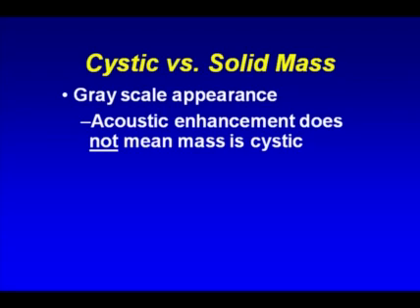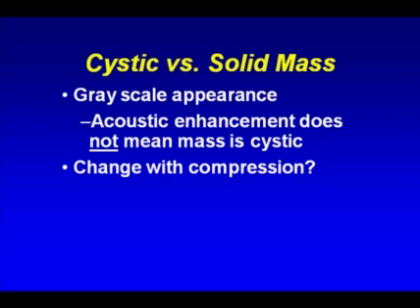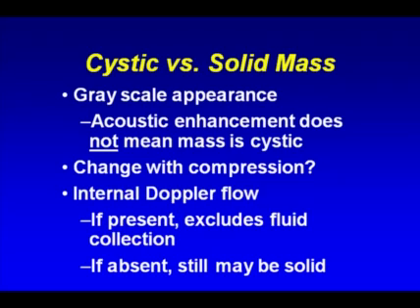The important thing to understand about the soft tissues is that acoustic enhancement does not mean the mass is cystic. And I will go into that in more detail in a little bit. The next thing is, does the mass change with compression? Because if you can demonstrate that it changes with compression, it shows that there is a fluid component to the mass. The next thing is the presence of internal Doppler flow. Internal Doppler flow is more helpful if it's present than if it's absent, because if flow is present, it excludes that the mass is a fluid collection. Of course, if Doppler is absent, it still may be solid and hypovascular. So again, flow is more helpful if present than if absent.